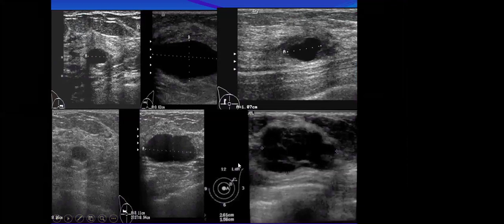I think fibrocystic breast is BI-RADS 1 until there is a lesion. I'm giving you multiple lesions. Give me BI-RADS for these lesions. So the first row, the upper row, they are simple, but the lower row, especially the last one, is... right or left? Lower right or left or central or middle?